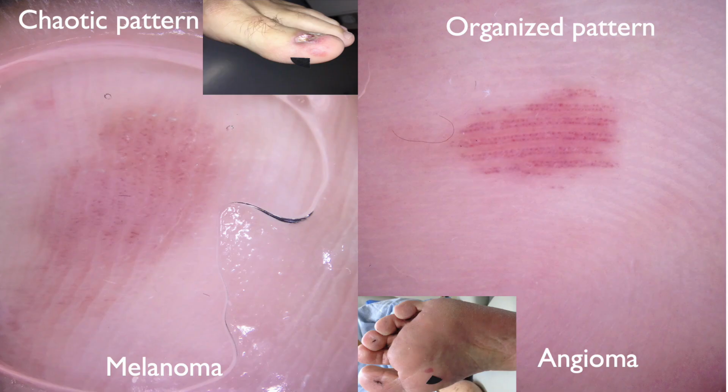And let's compare both. On the left, you have a melanoma. On the right, you have an angioma. As you can see, both have these red dots on the ridge, but melanomas tend to be chaotic or disorganized, and angiomas tend to be organized.